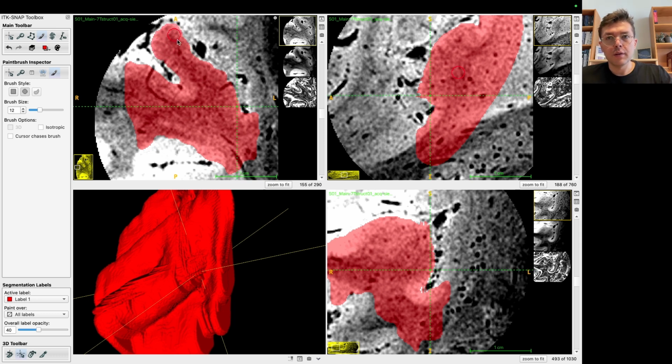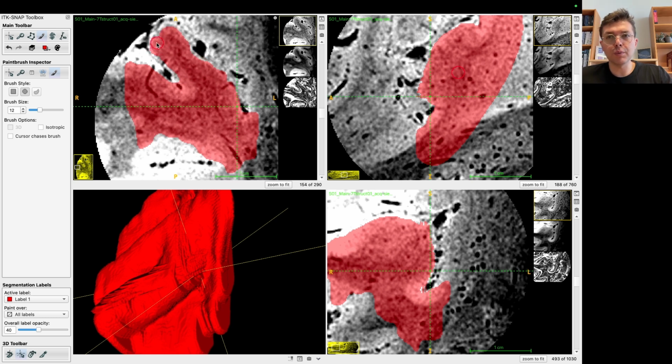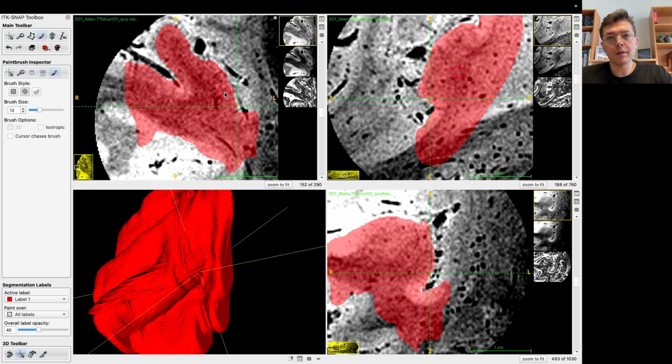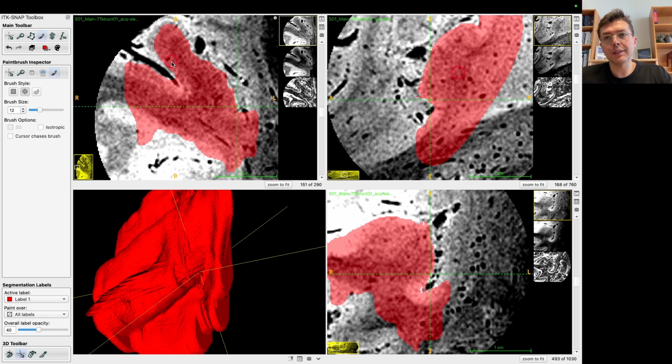And the registration between T1 weighted lower resolution images and this one that is way higher resolution is never as good as you want. So there are all these ways of going through segmenting T1, registering it, and so on, but for the precision that we are aiming at, to analyze this in high detail in laminar resolution and study the laminar patterns in the Heschl's gyrus, we need this type of precision.